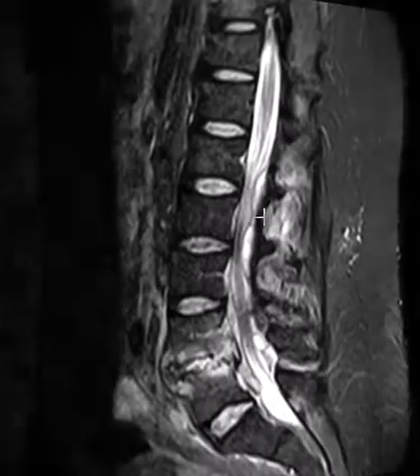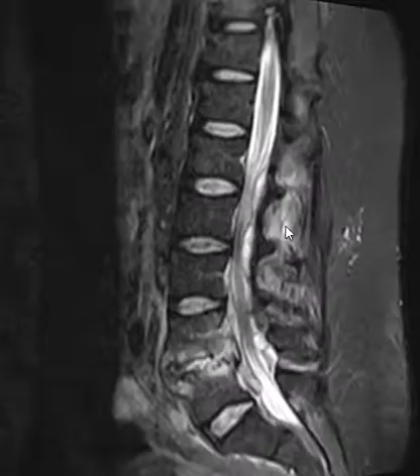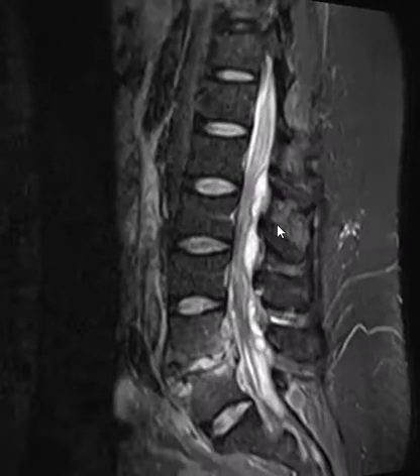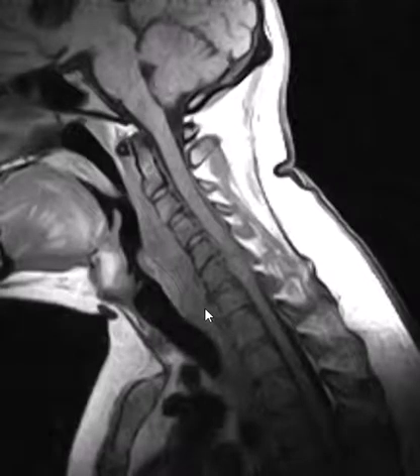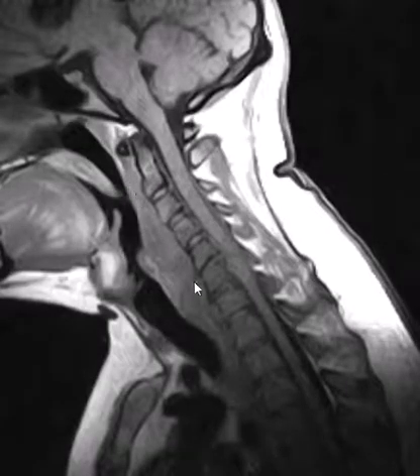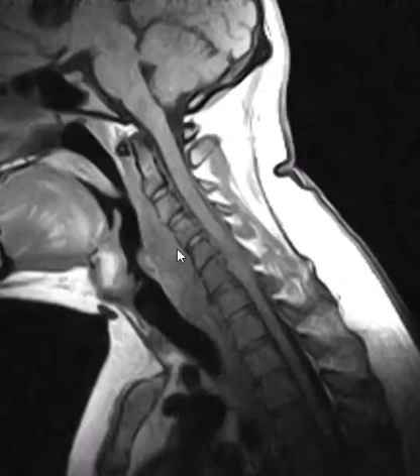Again, we couldn't get in touch with the patient, but we were able to get in touch with their parent, and they explained, yeah, they do have IV drug abuse. So that's patient number 2, and now here today is another patient. Same thing, roughly the same age group as the other ones, a male. On this view it's hard to see much, but you can see that there's lots of prevertebral soft tissue swelling. The retropharyngeal and prevertebral soft tissue space is all filled up, and that catches the eye.